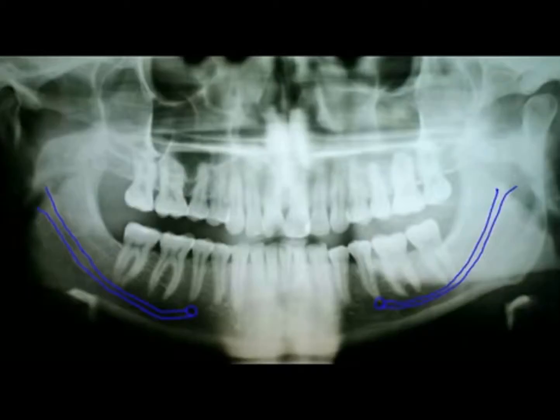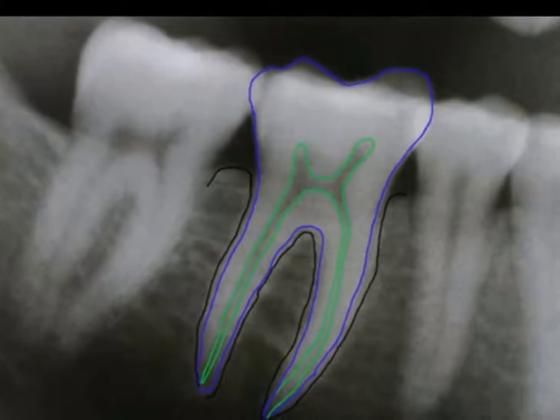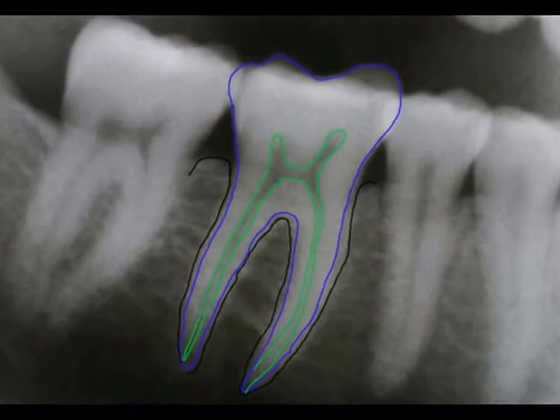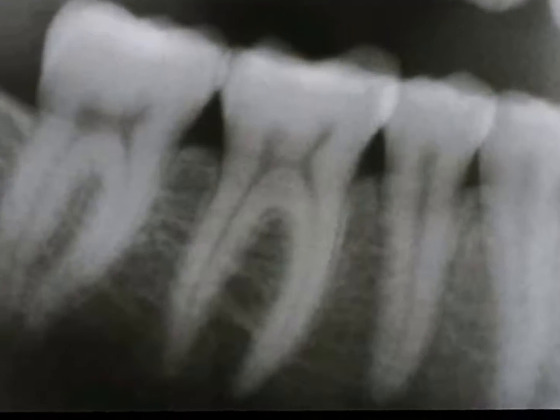You can see where the nerve leaves the lower jaw. From this opening on, it runs under the lower jaw and splits up into many small canals. You can recognize the teeth, shown here in blue, which are separated from the bone, shown here in black, by a very fine gap, the periodontal gap. The tooth also shows dark shadows, shown here in green. Here there is less dentine, which is why the picture goes dark. This is the dental nerve.